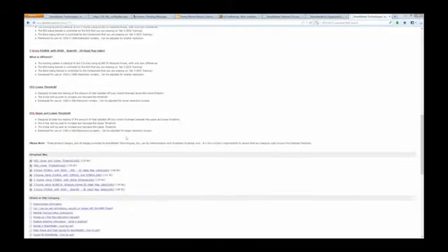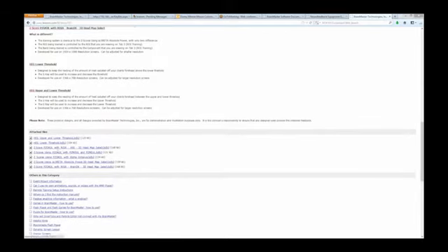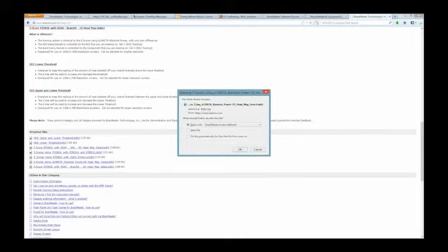It gives you a basic description about it, and then if you go down here, this is where the protocol is located. It is ZScore, yep, right here, this one right here. What you're going to do is download it. Well, let's walk through what you're going to do with these protocols that you find right here. I'm going to click it. And as you can see, it's going to give me some different options right here. I'm going to choose Save File.